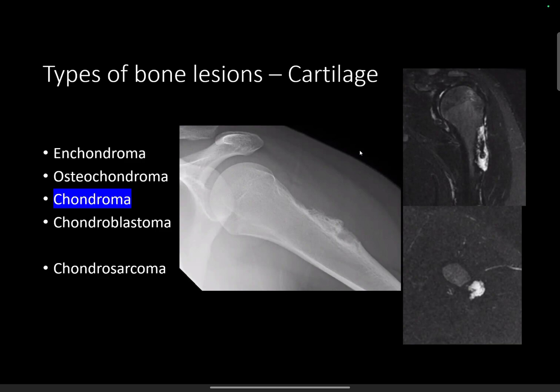Okay. Do you always use DWI in your MR protocol for a bone lesion? Yes. So in our tumor protocol, we use diffusion weighted imaging. Sometimes you don't use it, but we just have it in there just in case you do need it. And you can get an ADC value, which is very nice to document the number pre and post treatment. So if you have restricted diffusion, it's more concerning for a malignant lesion. And if you follow it over time, the ADC value will improve, will increase. And so studies have shown that, like with osteosarcoma, you can use the ADC value to help monitor treatment.